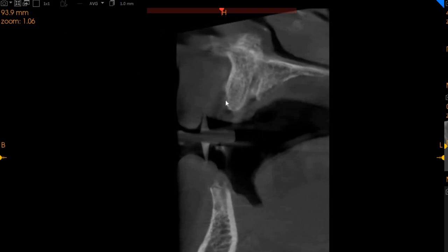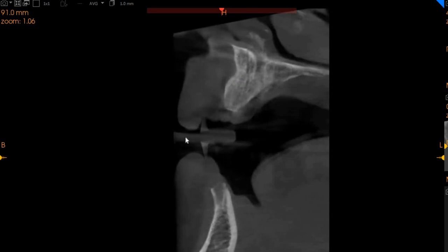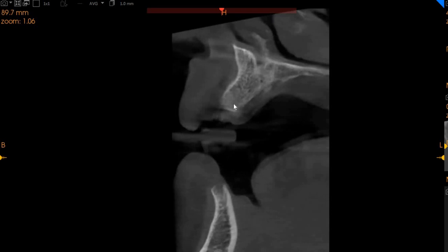We've got a good D3 level bone, 5.3 millimeters of ridge width at the crest with 15 millimeters of height and sufficient space anterior to the incisive foramen. Moving to the lateral incisor region, this is the lateral incisor region. We've got a slightly thin ridge and a slightly angulated ridge, 6 millimeters of ridge width with a good 13 millimeters of ridge height. So this is also implant worthy.